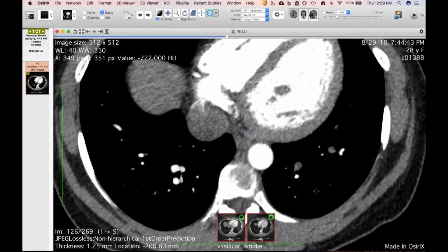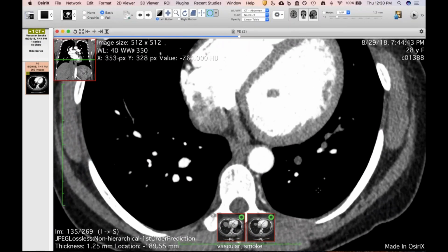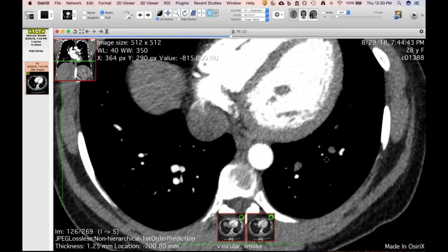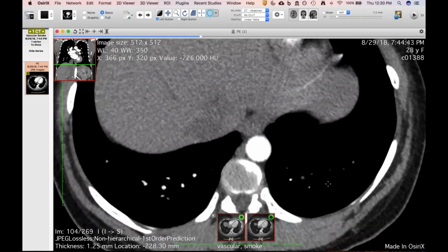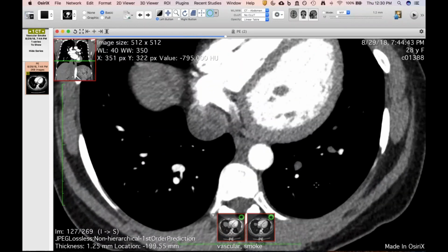I don't know if it's going to make a difference in the treatment, but I said if they wanted to, they could get more of a delayed phase. What do you guys think? Our vote, Travis, Chris Meyer and I, is that it's smoke, and it's just really smoke. Because there's probably a lot of distal thrombus that you can't see, so even though you see contrast, there's probably at the microscopic level lots of clot.